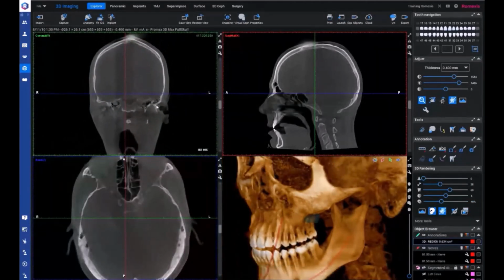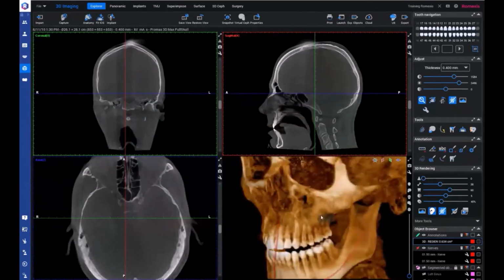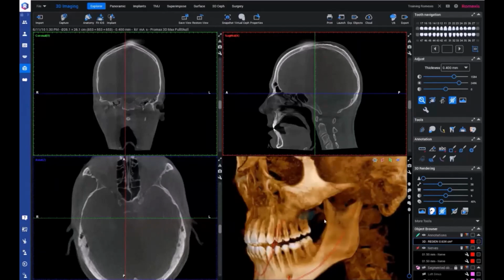Okay, one more thing that I haven't mentioned about the smart anatomy, which makes very much sense for bigger volumes, or volumes, for example, that we use for the analysis of the temporomandibular joints. So there are still these two modules that we haven't seen that I promised to show you today. So the TMJ module.